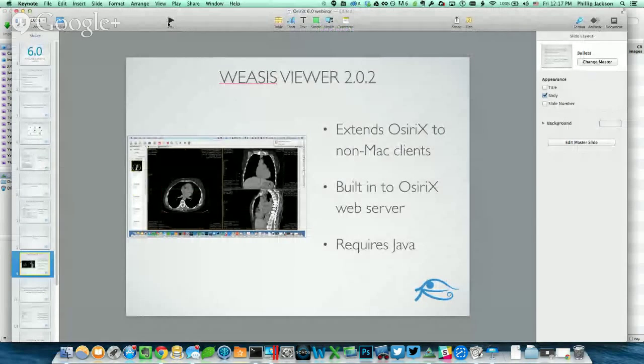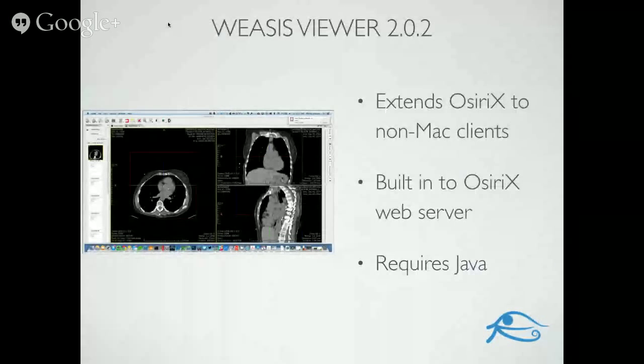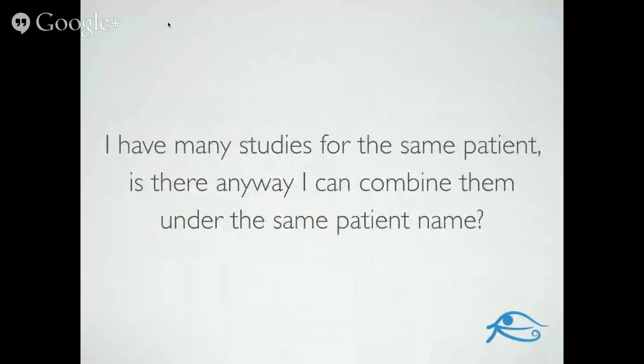We're real excited to see that in OsiriX 6.0. One of my favorite new features is the ability to copy patient demographics from your production environment, from your PACS server, wherever, from your cloud account, from your Purview cloud account, to a study that you've imported that might not share the same patient demographic information.